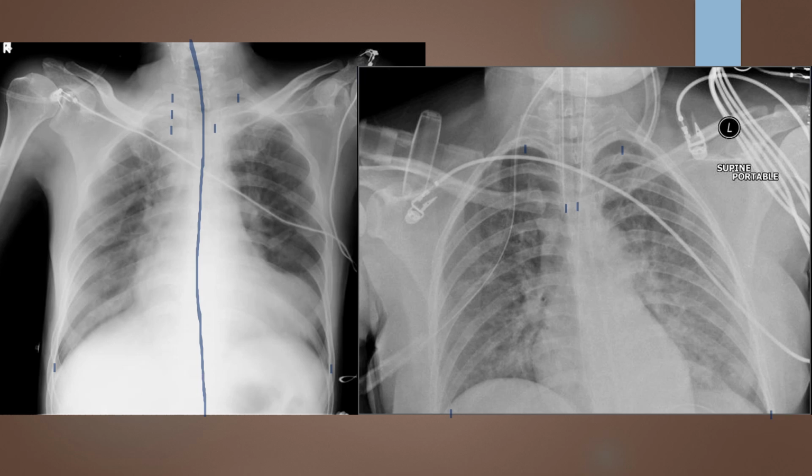Number 2, I want to make sure that the legalities are all there. Right here, we see that we have a digital marker. However, the patient did include some details that are important, but here it doesn't meet the legality qualities because of that digital marker. We'd also have to evaluate and make sure the patient name, date of birth, facility, date, and time were on the image as well. If we looked at all of that, we know we're probably going to repeat this unless it's just for ET tube placement.